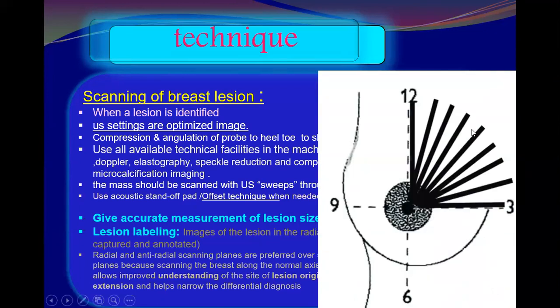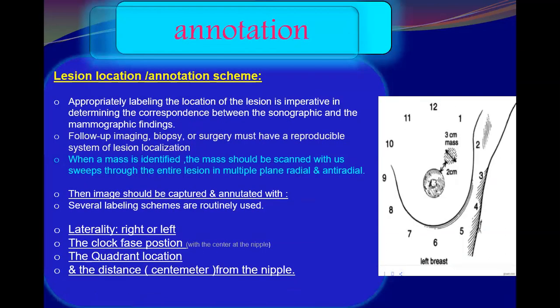Okay, this shows the directions of the ducts and the radial views, at the same time showing the clockwise. Okay, we said it is clockwise. Okay, lesion annotation scheme.